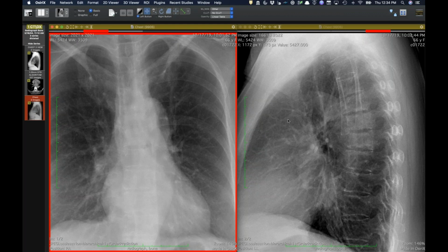I think maybe, now that I see that on the projection, I can see an abnormal paraspinal interface right at the level of the hilum above here. The more one looks, the more one sees. Yeah, I think abnormal exactly, on both sides. And then I was wondering, could this be some sort of multi-level infectious process like tuberculosis or something?